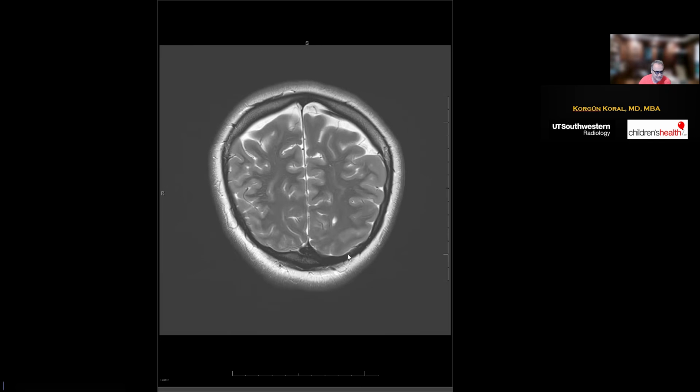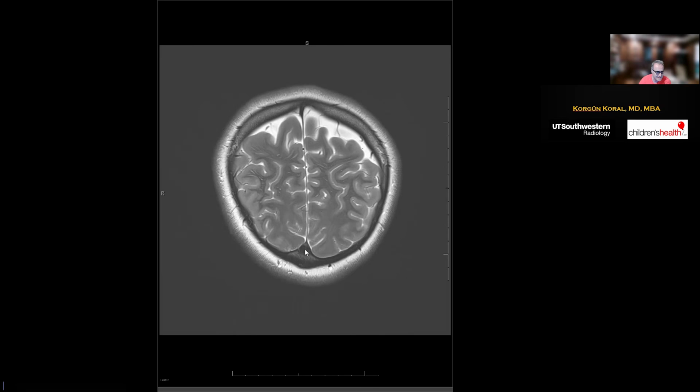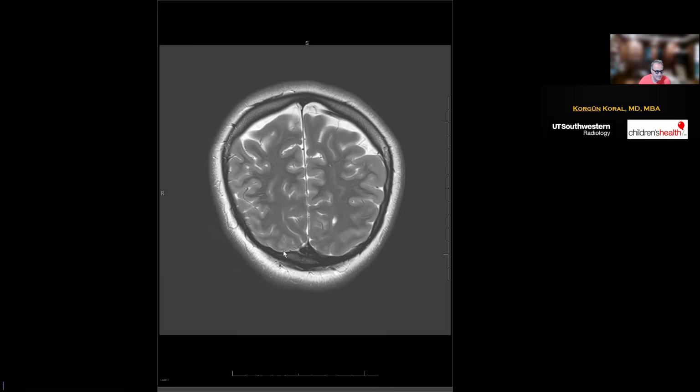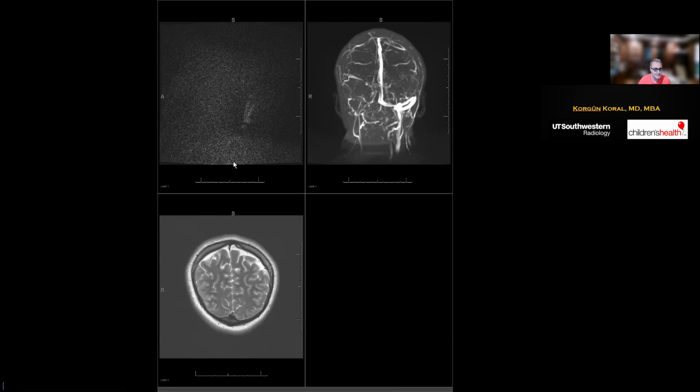As we discussed, acute dural venous sinus thrombosis will generate an enlargement of the sinus. Even if it's non-dominant, it will be a little bigger than normal, and we should always see some sinus to call it dural venous sinus thrombosis. So this was incorrectly thought to be dural venous sinus thrombosis. In fact, there was just a hypoplastic dural venous sinus on the right side. So we should always look at both the source images and the conventional images before we make a diagnosis. And that's it.